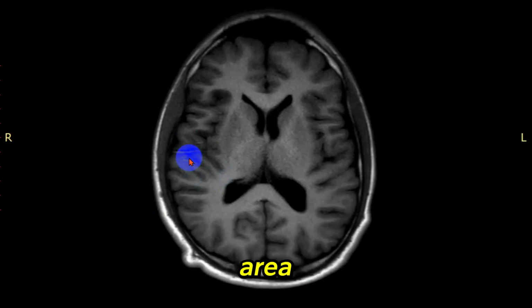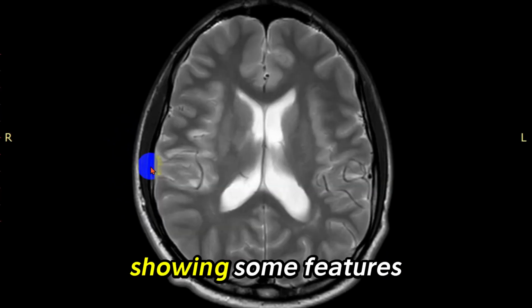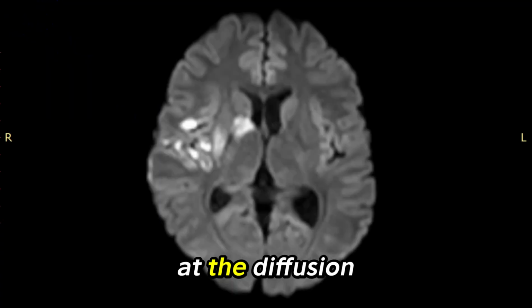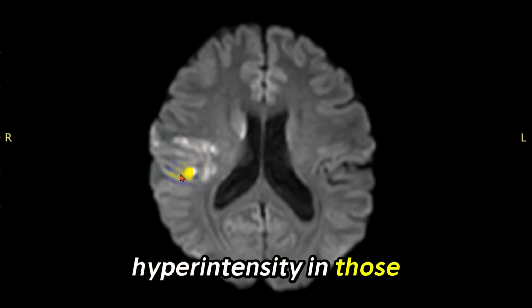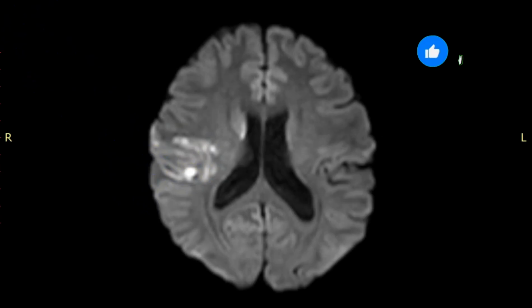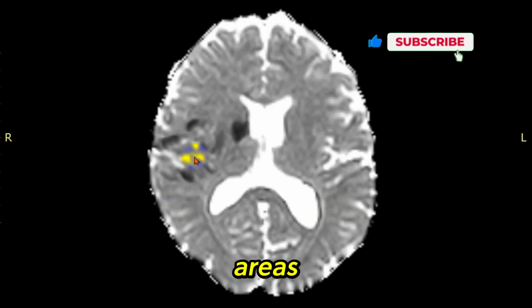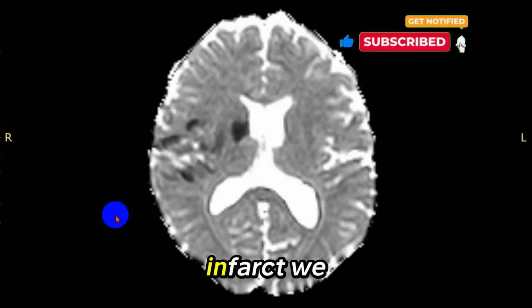signal intensity area. The same area in T2 weighted image showing some features of altered signal intensity at the same location. If we look at the diffusion weighted image, we can see that there is hyperintensity in those areas, and the subsequent ADC map shows hypointensity in those areas, so it indicates acute ischemic infarct.